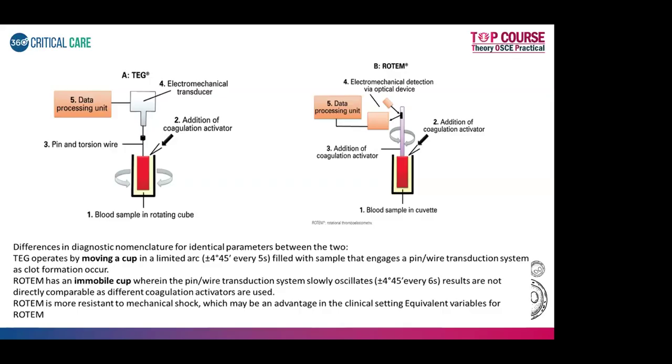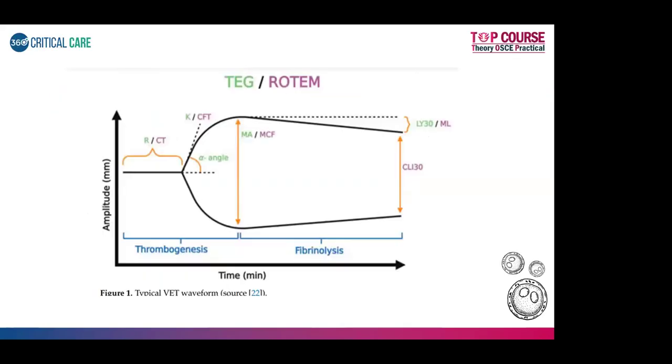But majorly there is no difference. Okay. That was the idea behind getting ROTEM. But it's not like TEG is inferior and ROTEM is superior. Okay. That is not the take home I want you to take. Both are equally good. Okay. You can use either one of them. Okay. So this is how you usually have a graph which will be given to you.